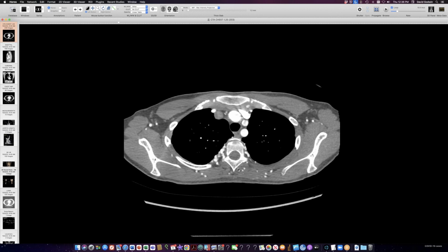A very good question for residents is, when you see that rib notching and you know it's a dilated intercostal vessel, which direction is the blood flowing in that? So this brings out a lot of the hemodynamics. Most people assume that the blood is going out from the descending aorta. That's the normal pathway.